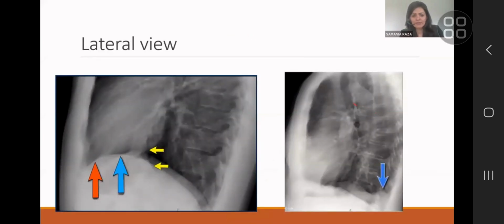And this is just another slide to tell you about the lateral view. We went through the lateral appearance of it, that the lung gets more lucent as it goes down. The other thing to remember is that there are two diaphragms. So on the lateral view, don't consider that an artifact. The right and the left diaphragm don't sit superimposed on each other. They're slightly off, so you will see both of them separately.